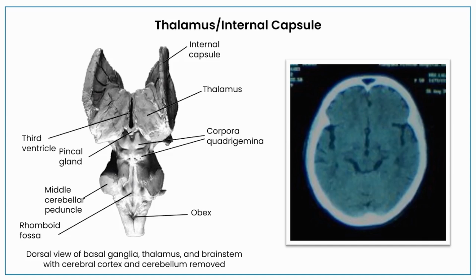We actually went past above it. So let's see how a quadrigeminal cistern looks. Look at this image right next to the picture which I have shown. Just focus on this image. Doesn't it look like a smiley to you? Like it has got two eyes and a nose shaped structure and a simple smile.